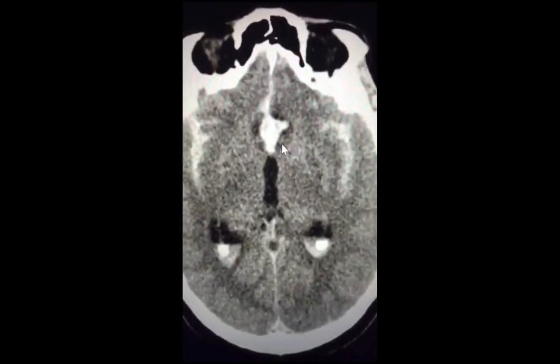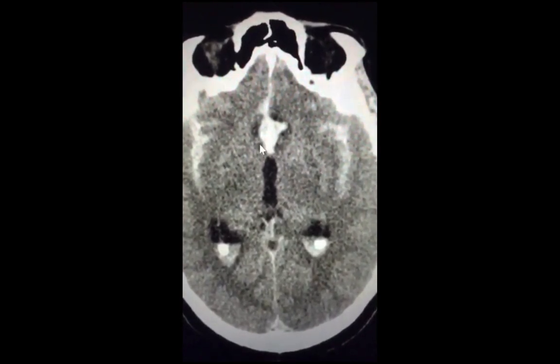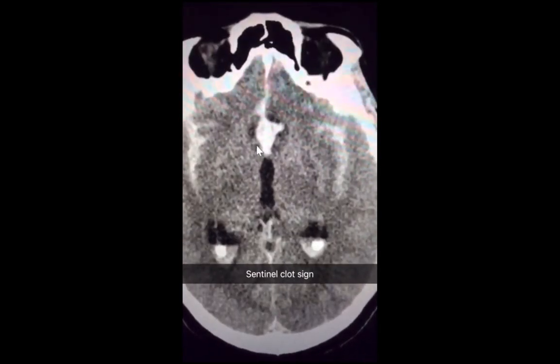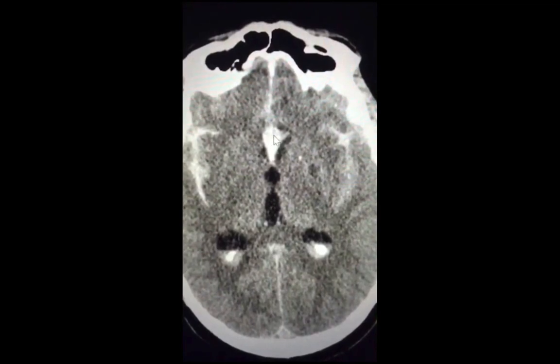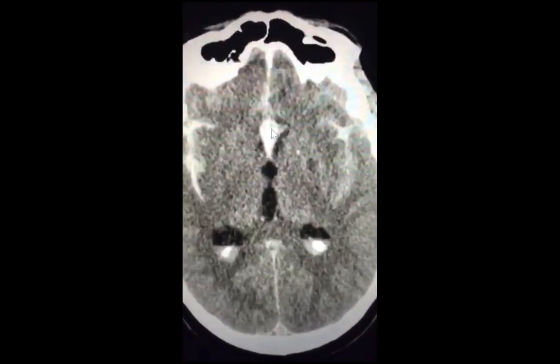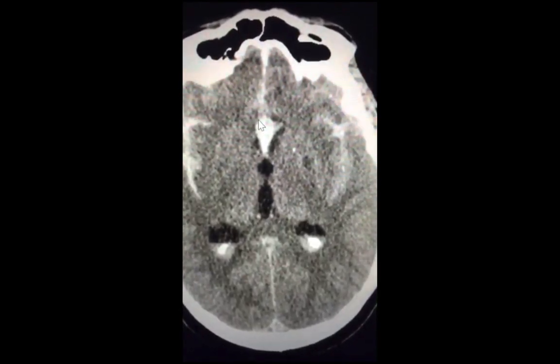And this is a hint that tells you that the aneurysm causing this subarachnoid hemorrhage is likely living there. This sign is called the sentinel clot sign. Since this is a non-traumatic case and there is a sentinel clot sign in this region, you suspect that the aneurysm will be located there. This is the expected location of the anterior communicating artery that connects both anterior cerebral arteries.